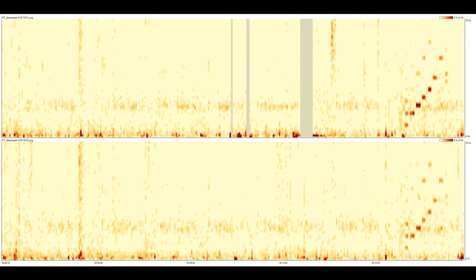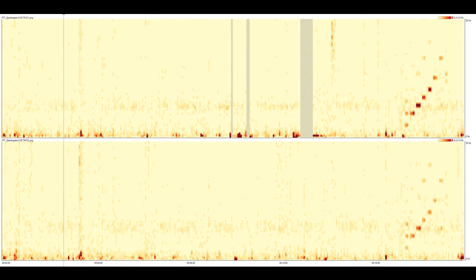First, it does not jibe with the electroencephalographer's visual gestalt of the frequency makeup of the EEG. The EEGer doesn't think in the expanded scale of a microvolt squared representation when considering the relative frequency mix of various EEG patterns. The second problem is that, for any given minimum and maximum values chosen for the z-axis scale, a power microvolt squared scale reduces the dynamic range of EEG activity that can be clearly rendered on the graph. This is easily demonstrated in this example.